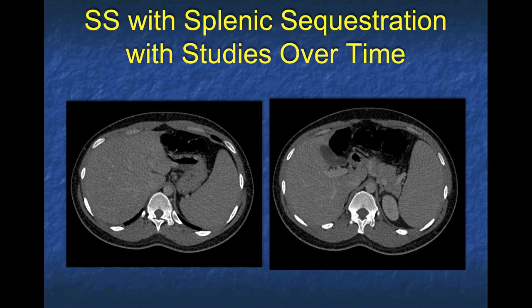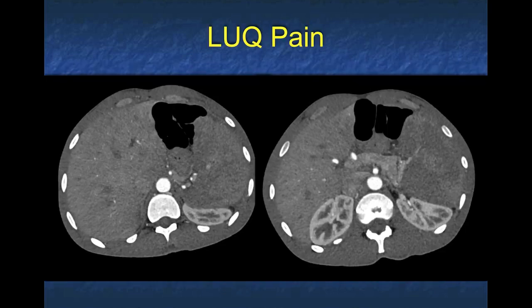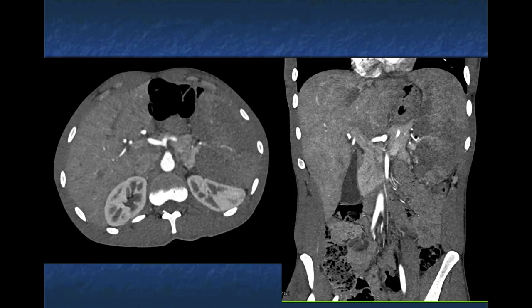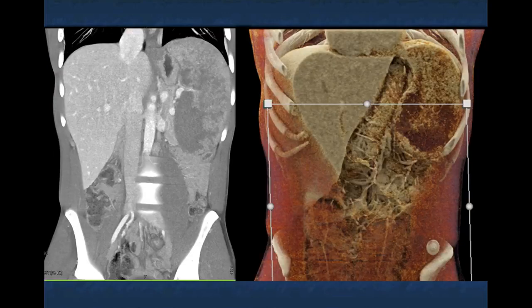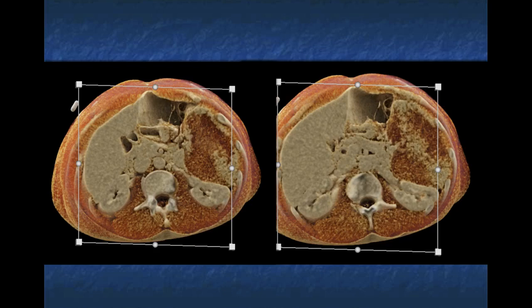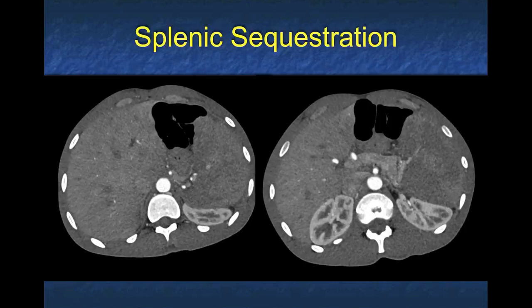Often patients with sickle cell have splenic autoinfarction and a small calcified spleen, but it can be normal in size, or large. But then you see as they experience pain and splenic sequestration, you see the low density. Just a beautiful example of sequestration. Now, just to show you, you can sometimes see that again as another example, which I thought I had blocked out, but there it is again, beautiful sequestration. Again, you could think of infarcts. It's kind of in that same category, but the fact that it's peripheral and a substantial area of the spleen is involved makes this a beautiful example of sequestration.